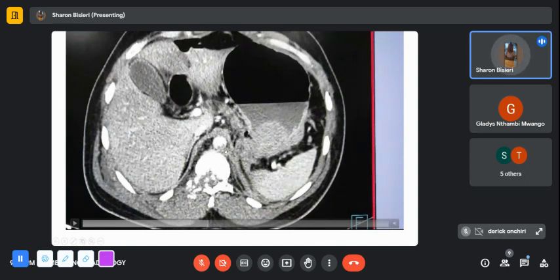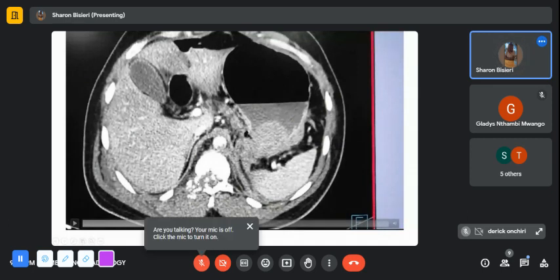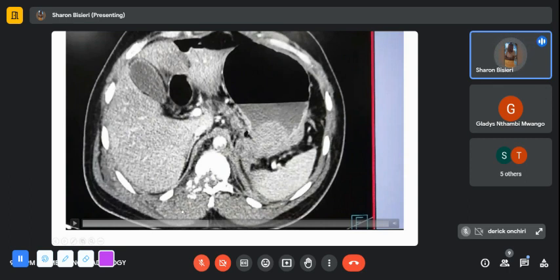Then in the adjacent aorta, we can note that there's a filling defect. I don't know if this would be an outside-in injury to the aorta. And then we had fracture fragments within the spinal canal. And then the pedicle on this side, the transverse process, and the lamina were also comminuted, and there were also some air locules where the exit wound was.